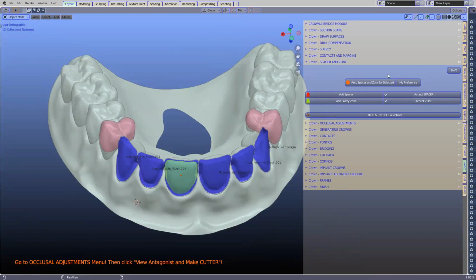You've got here my preferences. If you've got a different default value in mind and you want to pick a die space or whatever, let us know and we will prepare a file for you. You put it in the model designer. There's a my preference file. You throw that one in there, and when you click on this one, it will call up your preferences.